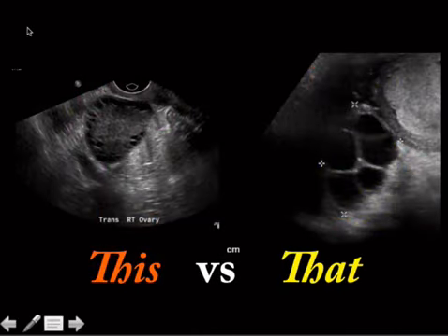All right, now let's move on to some ovaries. So we've got 2 ovaries, both of which have a bunch of cyst-looking things, follicles, big ones, but they're different, right? We've got the gigantic ones that are clustered.